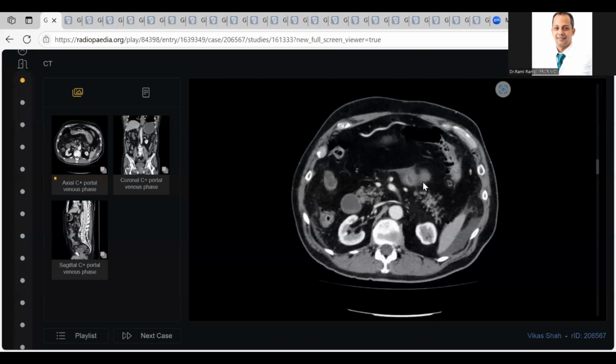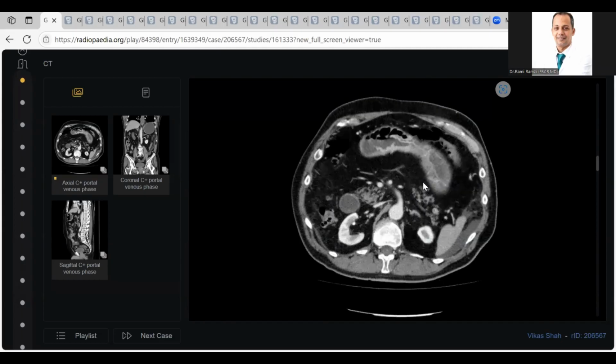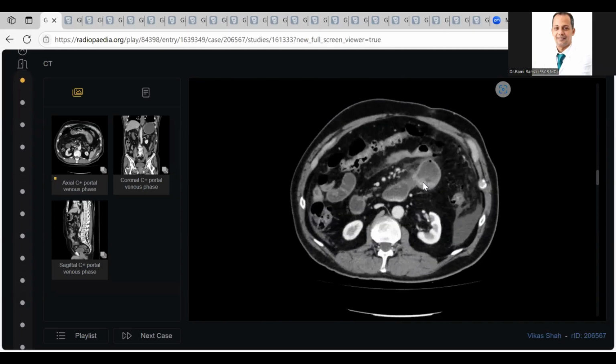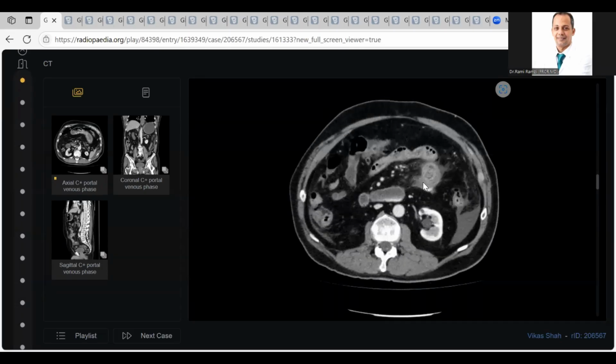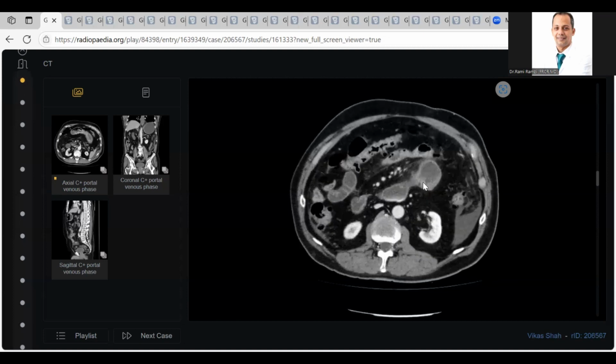Sir, it can be some metastasis to the pancreas, or it can be multiple pancreatic islet cell tumors, which are enhancing. Excellent. So please build up your diagnosis. Bowel perforation plus two pancreatic hyper-enhancing or hypervascular lesions. So give me a logical differential diagnosis, please.